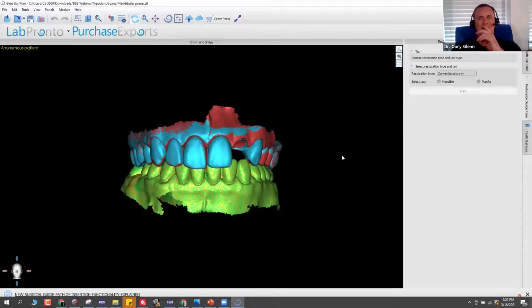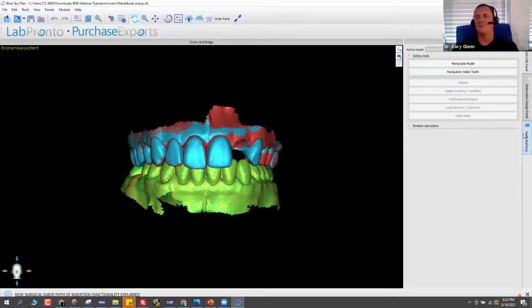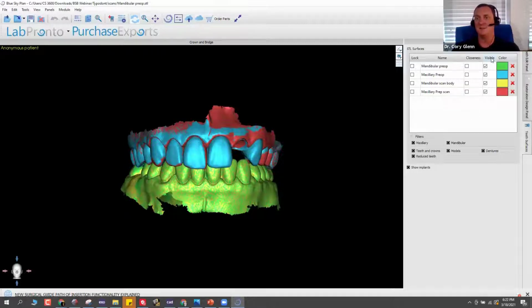Well, I don't know how to hide that, so maybe I can just move it. Yeah, let's do that. All right, so the start to make a crown is, I would suggest, go ahead and position some teeth.